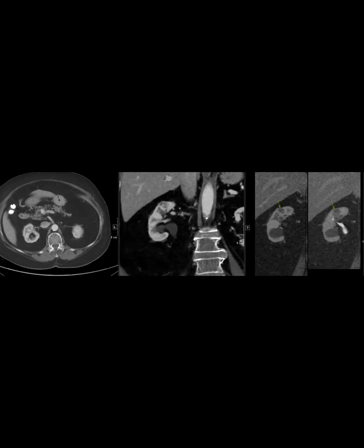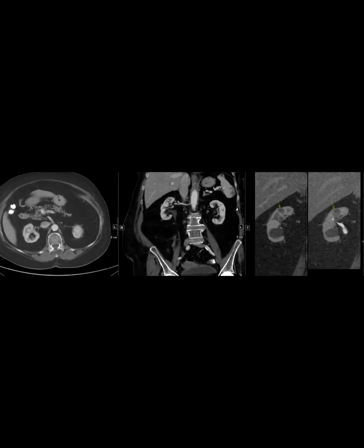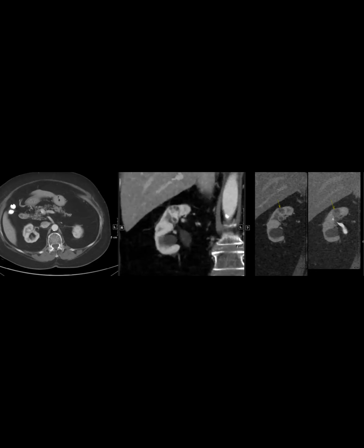I don't know why it's jumping like this, but. I feel like you want us to see that it might be herniating into the renal pelvis, but otherwise it doesn't really look like a multilocular cystic nephroma to me. It looks too solid. Solid, right? But this is what it was. This was multilocular cystic nephroma. Somebody sucked all the fluid out.